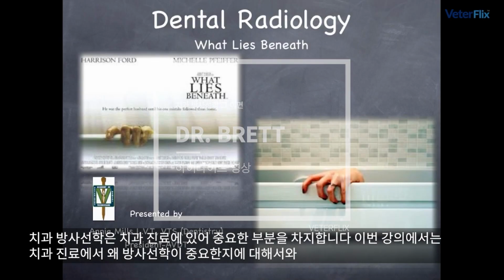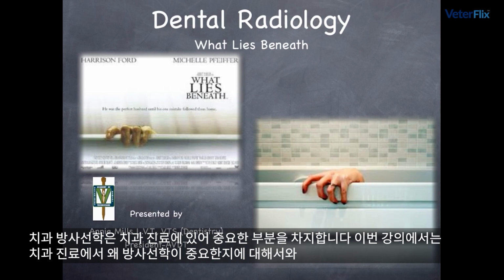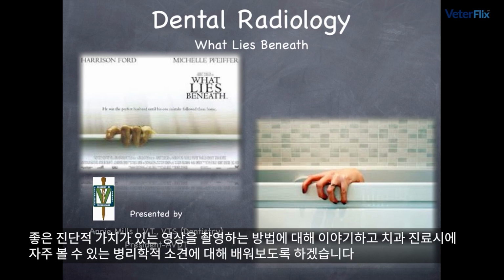Dental radiology is an important component to your overall dental service. We're going to talk about specific reasons why it's important, as well as some of the techniques for taking a good diagnostic image. And we're going to talk about some common pathologies that you'll see in your dental practice.